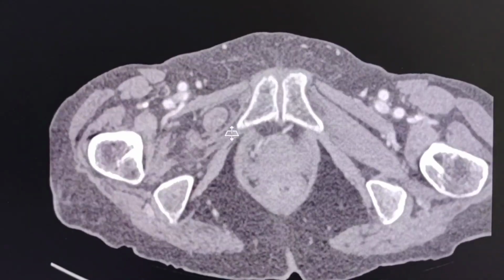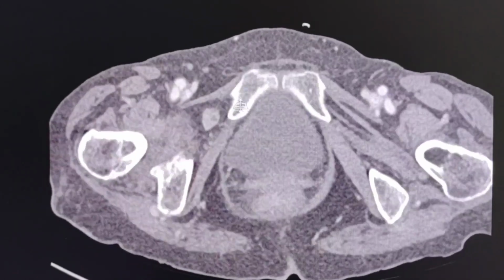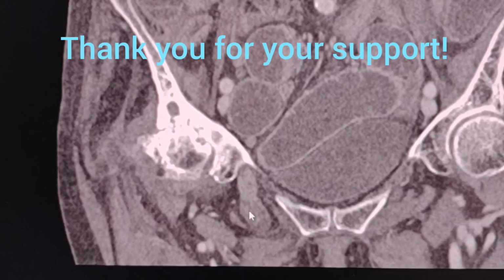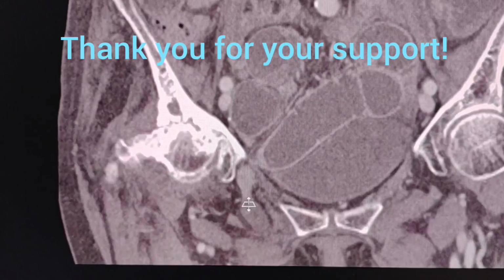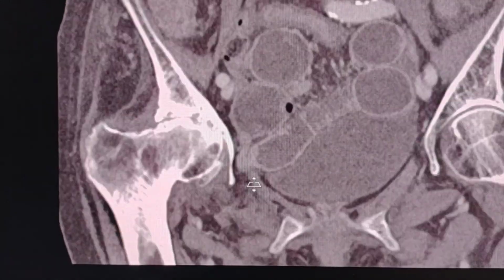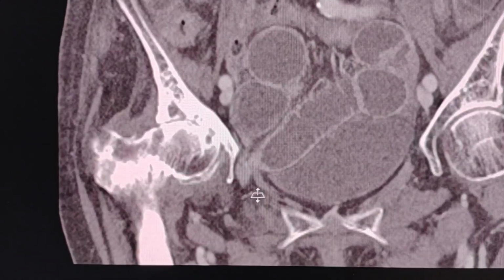Sometimes clinical diagnosis is challenging. That's why CT scan can give the answer to the clinical query. Here the finding in coronal view. The right obturator hernia and small bowel obstruction.